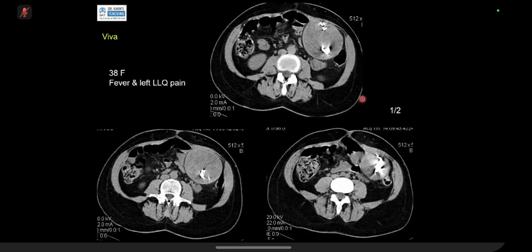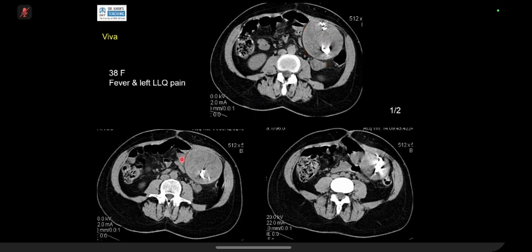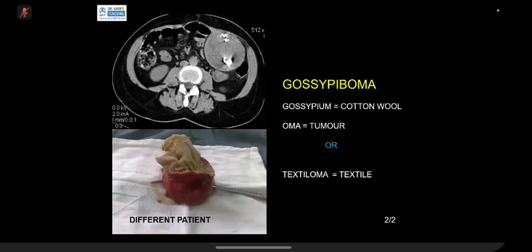Classical exam case in which you have to stretch your imagination. What is happening here? Artifact is there, very good thought. So there is an artifact. Now think what is happening. Around that artifact, there is something here. Foreign body is a very good thought. What else? Next. Say again. Not a drain insertion. So your thought process is good. Let me give you a hint. Our friends, the surgeons, were involved in this. This is a never event, another hint. Right?